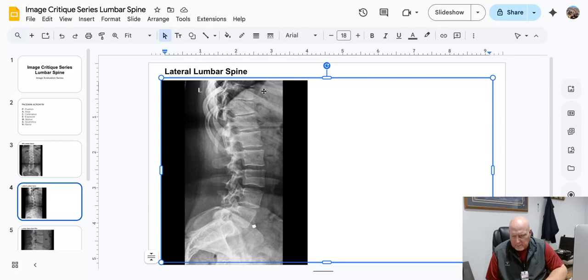Okay. Now, when I spoke about a spot film earlier, you'll note that where the spine comes down into the pelvis right here, and we have our hips, and it kind of offsets it a little bit when we're laying on our side. And that causes these joint spaces down here between 4 and 5 and 5 and S1 to be closed a little bit more.